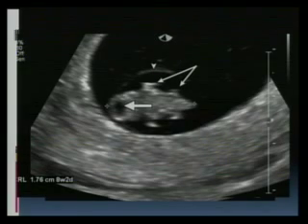So just imagine that this is a large housing community. The embryo has its own private apartment. Okay? So this is the private apartment of the embryo, which is the amnion, in this large housing community, the gestational sac. Does that make sense? I have seen once or twice people not recognizing a normal structure like amnion and calling it linear echoes and this, that, and the other. No. It is an amnion. It is a private apartment housing for the embryo. Does that make sense? Based on the number of amnions and so on, which we will not discuss today, we will determine whether this is monozygotic, dizygotic, what nature of twinning is happening. But we will not discuss that today.